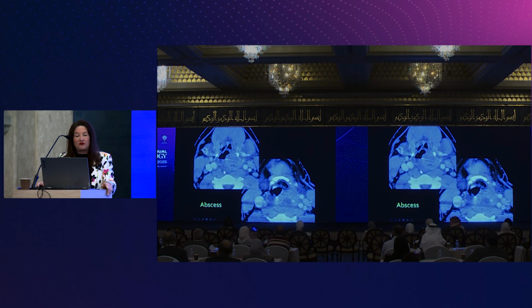You can see the retropharyngeal fluid. These often come from direct extension of a pharyngeal infection or from rupture of suppurative lymph nodes. But I just want to remind everybody, in the very acute setting, abscesses frequently look like solid masses, so you must look at these studies in the context of the clinical history. This is a very sick patient with fever and an elevated white count.